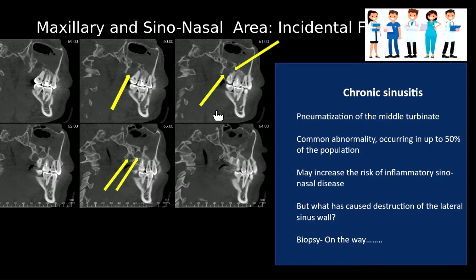The story of this patient: about 10 years ago, they tried to remove the number 1 area, and they did remove the number 1 area. They did a biopsy too, and they thought it was a dentigerous cyst, and they took it out and left it, and it gave rise to 3 OKC, odontogenic keratocysts. And I told you, OKC is not nice. So the biopsy turned out to be OKC.